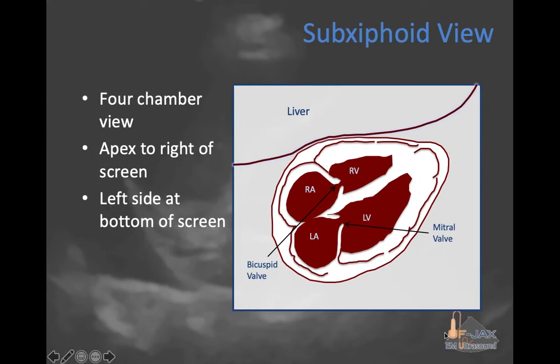This is a schematic view of the subxiphoid plane. Notice the liver lies at the top of the image, corresponding to the structure closest to the probe. This makes sense when you recall that our probe is in position in the epigastrium. We're using the liver to displace the bowel and create a window so that we can view into the chest cavity. Since we're viewing the heart from underneath the diaphragm, the left side of the heart is farthest from the probe and at the bottom of the screen. Notice that this is a 4-chambered view of the heart.